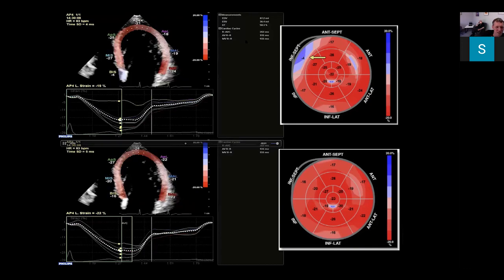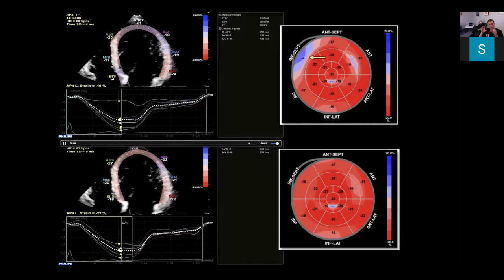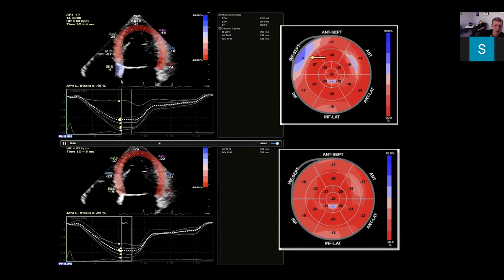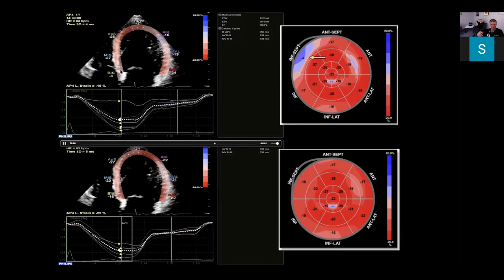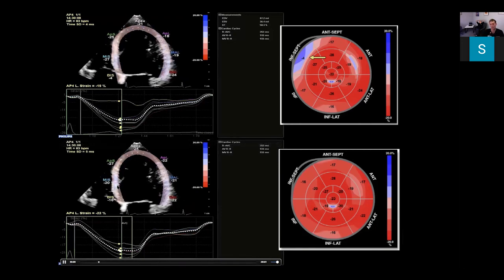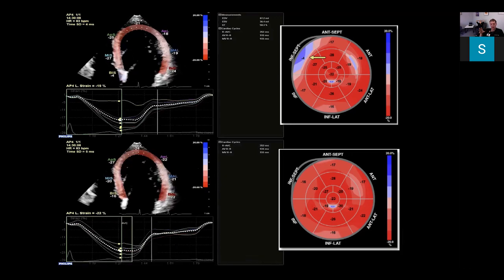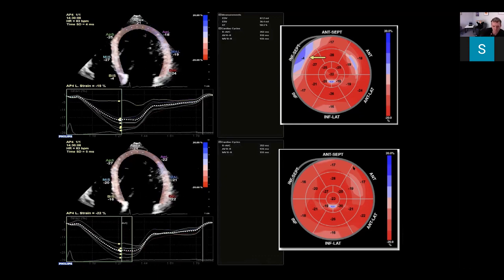If we could train our eyes to have a look underneath, we can see that it's actually moving and it looks like it's thickening. So something's definitely out. And you can see that this basal segment looks like it's tracking half of the atria, right? So this would be an example of where we've got a badly placed region of interest. And if you put it in the right spot, as you can see at the bottom, it shows you a normal strain curve. That's why you've got to have a good understanding of normal heart function before you start jumping in to look at strain curves, right?